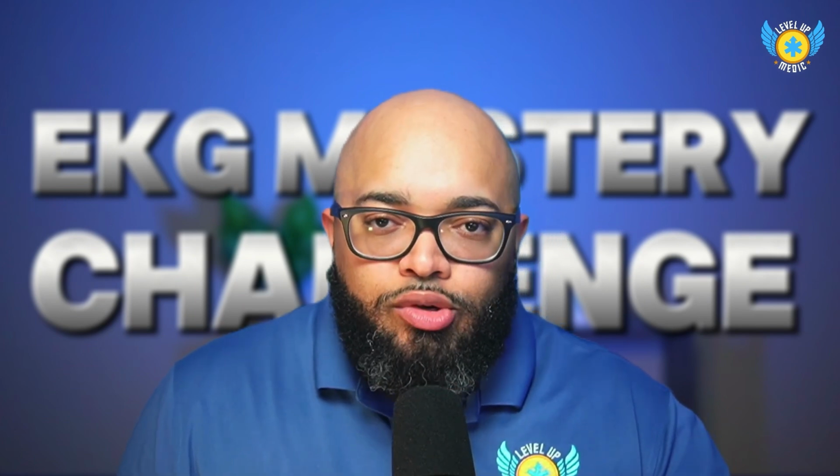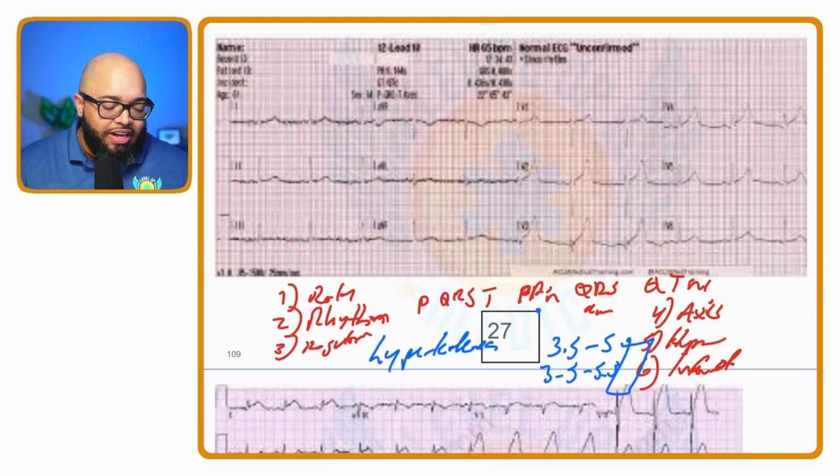But the longer it goes on and the higher it goes, for instance, you'll start seeing changes in the T wave. You'll also start to see the QRS starts to get affected. The P wave even changes. The PR segment, which makes up the PR interval, also starts to change. So you're going to see several changes within the EKG the higher the potassium goes, okay? But this is an example of hyperkalemia.